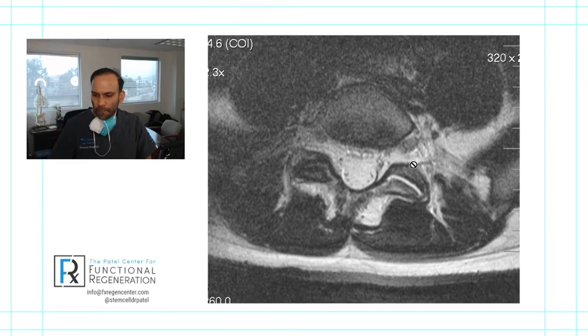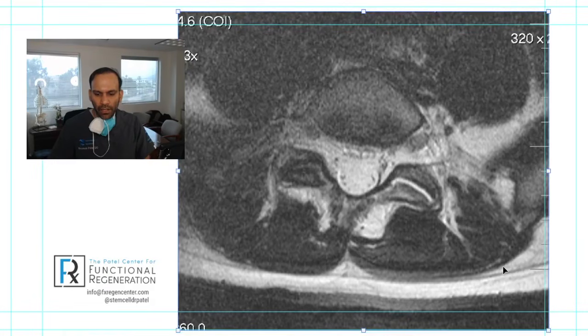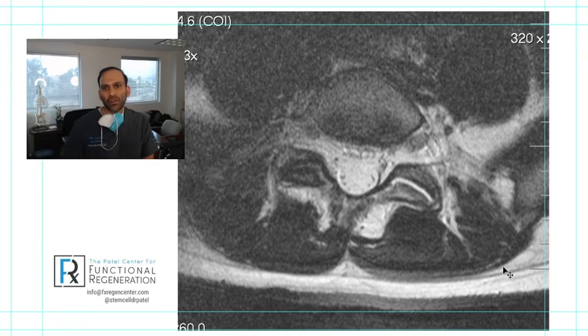So this next picture here, now we're looking at a facet joint that for all intents and purposes is not horribly arthritic, but has something different in it. So what's the difference that we see between this facet joint and the other one? We're looking at this joint here versus this joint here. Again, it's a little bit of an asymmetric cut, so we can't completely do apples to apples here. With this joint on the right side, you're getting a little bit of roughness to it, but otherwise it's not a horrible looking hamburger, right? Still looks like a little hamburger over there.